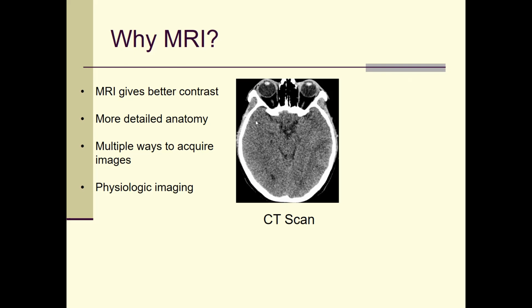The brain tissues are much grayer, and the water content in the ventricles and the CSF space is much darker. With this gradient of grayscale, you can visualize whether destructive lesions happen in the brain, which we perceive as a low density focus.